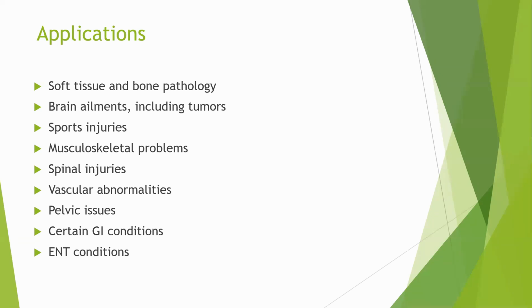So when you are looking at the lumbar spine, make sure, write it down, make sure you also look at the pelvis. That includes the two innominates and the sacrum. Okay, lumbar spine, sacrum, two innominates is what you have to always look at. All right.